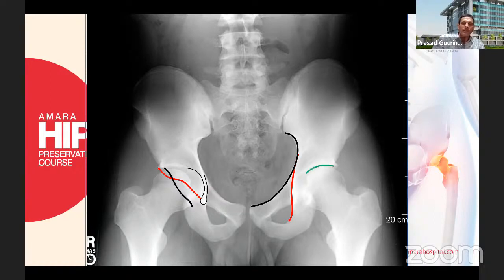That's a sourcil. The sourcil is the subchondral bone that's being seen, right? Which is taking load, so it's dense. If you notice here, my line did not go all the way to the corner of this bone because the sclerosis stopped where I stopped the line, and this bone is not intra-articular. This is extra-articular ilium. So you need to make a distinction as to where the sclerosis stops when you draw the sourcil and measure the angle. This part that's not continuous with the subchondral bone and elevates up a little higher and outside, that's extra-articular iliac bone.